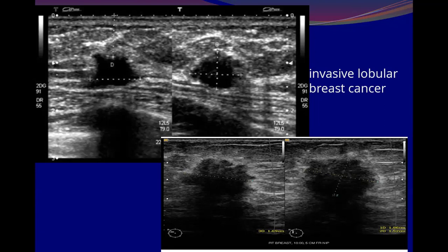Regarding the time gain, you mentioned that the subcutaneous fat should be medium gray. So in the lower image, it's medium gray. In the upper image, it's not. And that is why the lesion appears as a cyst in the upper image.